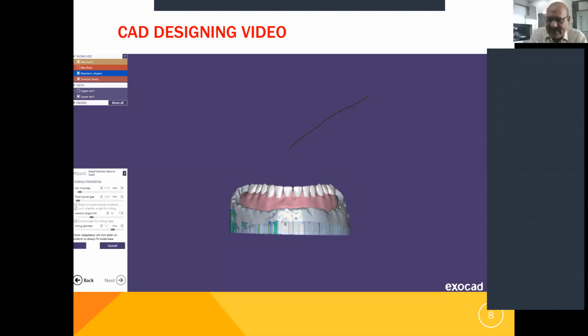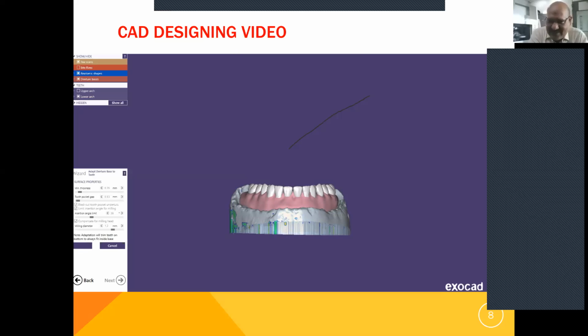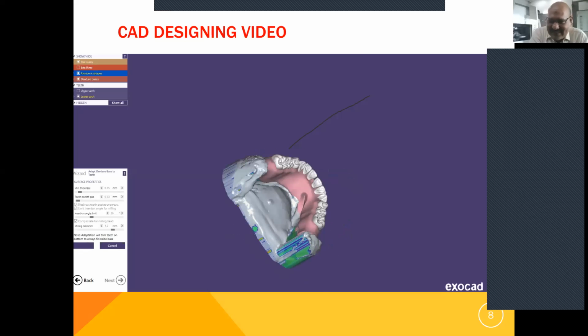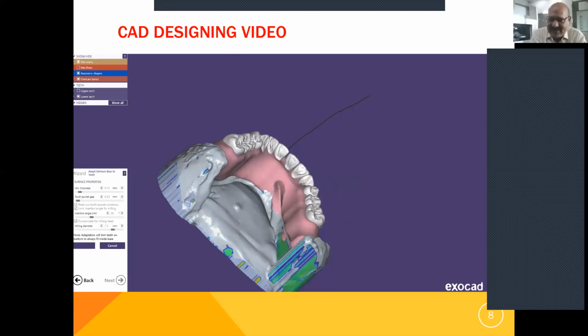The teeth you can modify to the individual's jaw relation, height, and mouth size. So that is a big leverage we have in freehand designing. Otherwise, when the patients open the mouth, you can say, oh, it's a Dentsply kind of teeth, Rock teeth or Sinew teeth. This is a freehand design of teeth, which matches the face, the smile and everything.